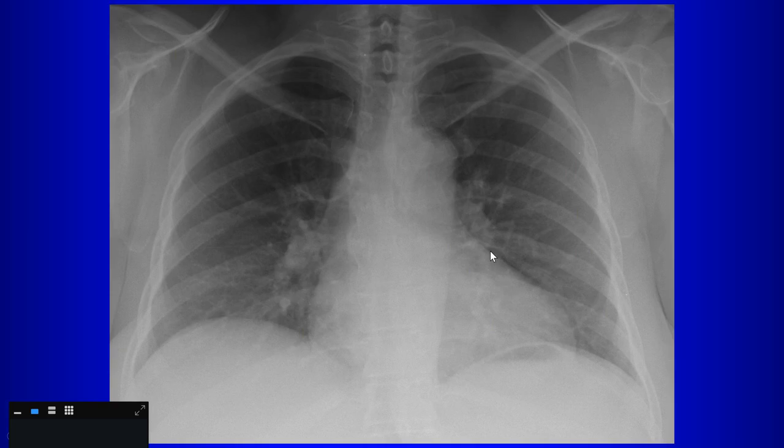And it comes up sometimes, from the ER, they'll call us and ask if that's a pneumomediastinum next to the heart. This is a common location where it looks like there's lucency next to the heart, but because of the pulmonary artery there and the density at the edge of the heart, sometimes people mistake that for pneumomediastinum. But as a radiologist, you recognize that's just some optical illusion, if you want to put it that way, and it's not really pneumomediastinum.